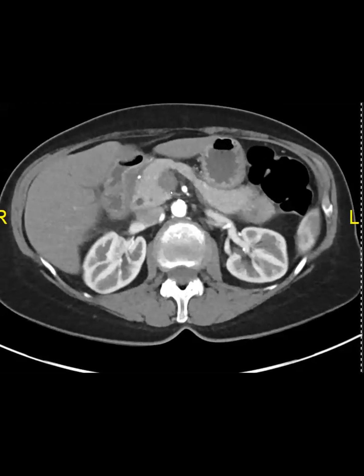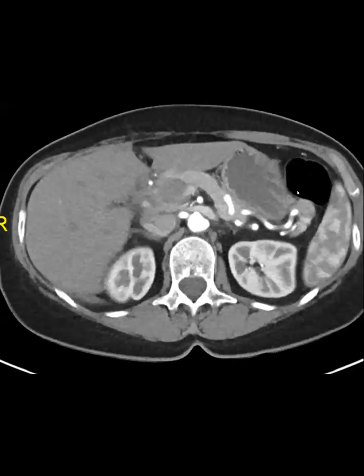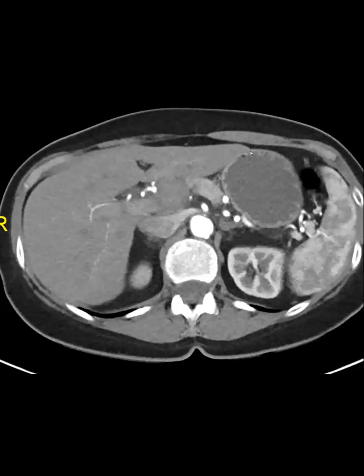There was no pre-contrast on this one. So I said, honestly, I think this is some sort of pseudoaneurysm that was probably partially thrombosed on the MR, and by the time the CT was done, it was already thrombosed. They were like, why would she develop a pseudoaneurysm? She has no trauma. I don't know, but anyway, I said, can you please review the EUS sample? Is it possible that the EUS sample is consistent with coagulated blood?